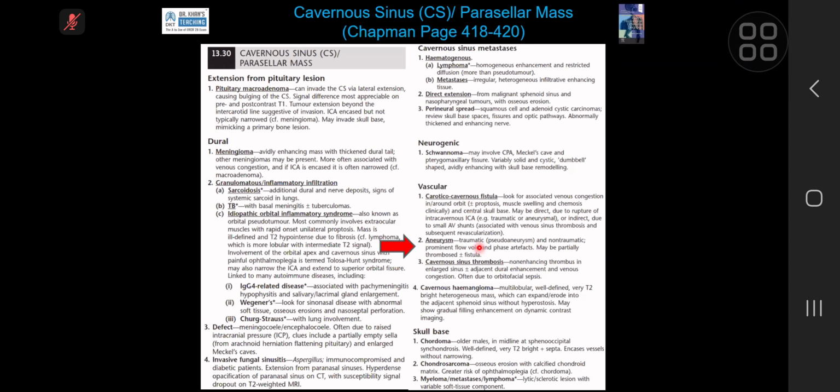This is a large one which is on conventional angiogram. Okay, candidate 2, well done. You did very well. Thank you, sir.